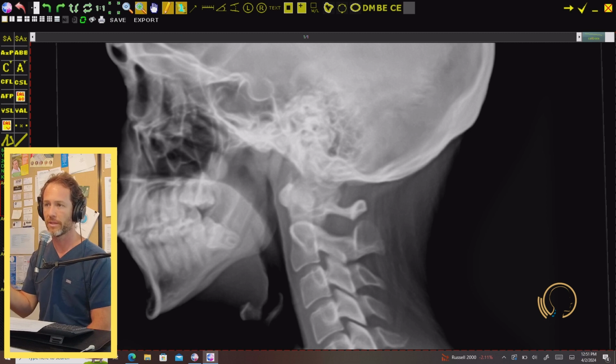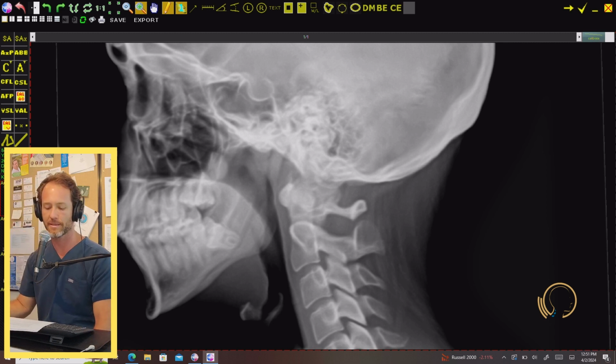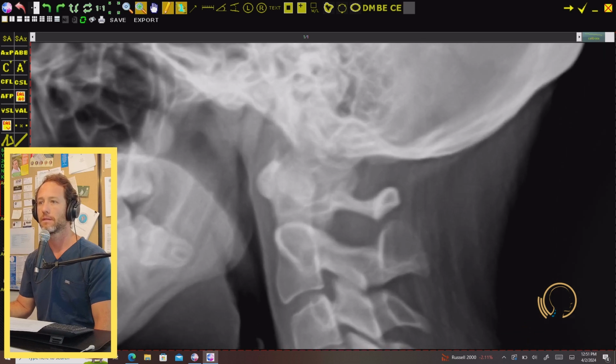And three, the location of your transverse process. And for anybody out there watching, it's not necessarily in the middle of the tragus notch, but I'll get into it. And then sort of your bonus would be the advanced orthogonal principle called dimensional transpositioning. So I'll kind of touch on all these. If we're going to construct an atlas sagittal plane line, all right, let's kind of zoom in here.